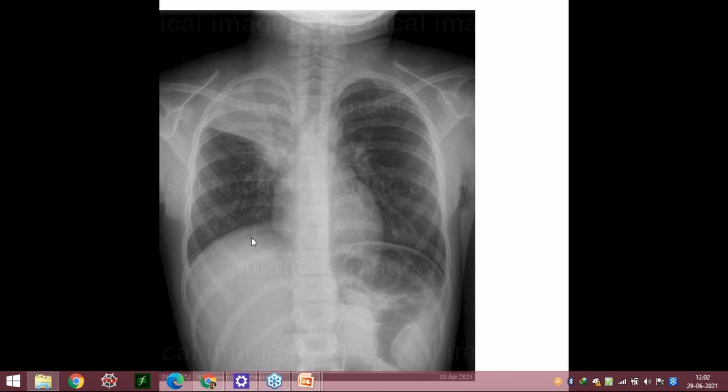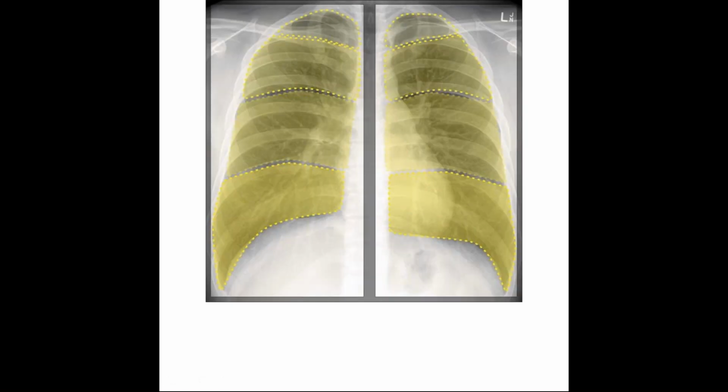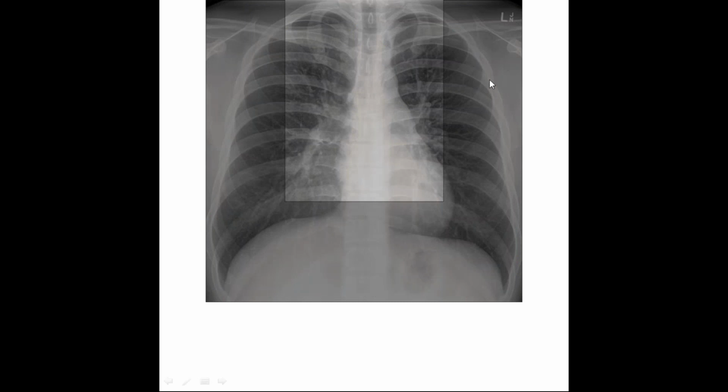So if you go about the PA view, how do you say that this is more prominent? It is the same thing. The ribs come forward, and posteriorly the rib is completely seen. What you are misinterpreting is the prominence; it is not that the posterior ribs are prominent. The anterior rib comes here, and then this is the cartilage. This cartilage is not visible on the X-ray. That is why you are not able to follow the anterior rib completely to the sternum. The sternum is not visible here, and the cartilage is not visible. So the anterior ribs come and end here, and you are not able to follow them completely. It is not that they are not prominent. The prominence is there. It is not that anteriorly or posteriorly it is more prominent as far as the rib is concerned. It is about the structures which are better seen.